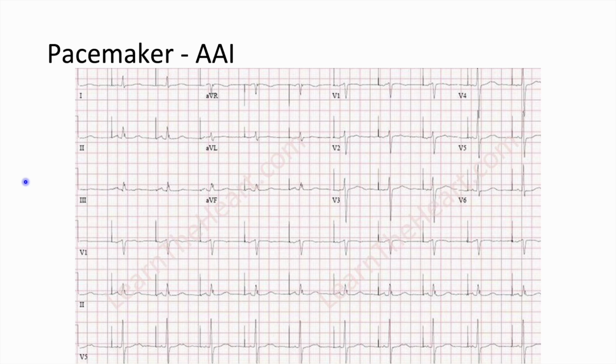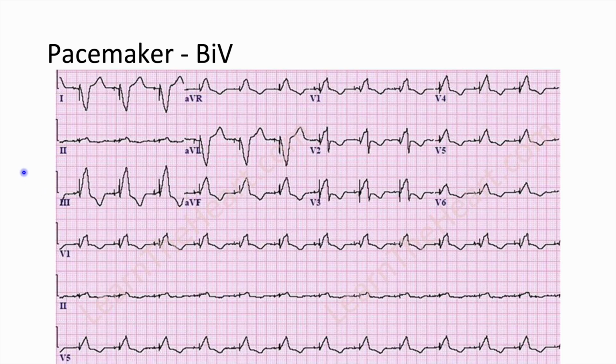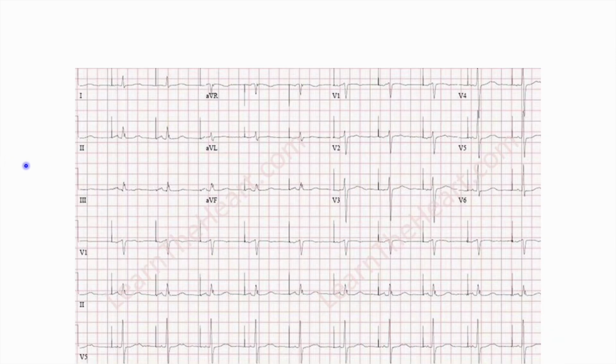3, 2, 1. This one is also a pacemaker. You probably picked up this extremely narrow, one line spike right before every systole. This is an atrial pacemaker. You can see spike, then we have P wave, QRS. Spike, P wave, QRS. Those are just the two pacemaker leads. Just so you don't get confused in clinical rotations, if you see that, it's being paced. This is not a major arrhythmia, it's just being paced by the pacemaker.